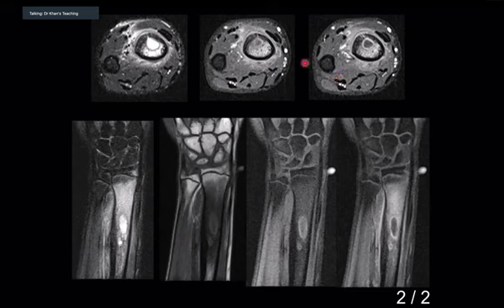On other axial sequences, you can see a cortical breach here, and a lot of edema. So this is a classical Brodie's abscess, and it's not Ewing's or anything like that. There is a sign here on the T1 weighted sequence, which I will come back to, known as the penumbra sign. It is visible here, but I'll show you.